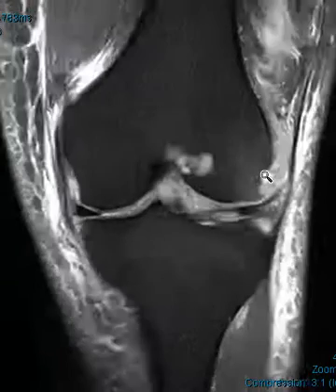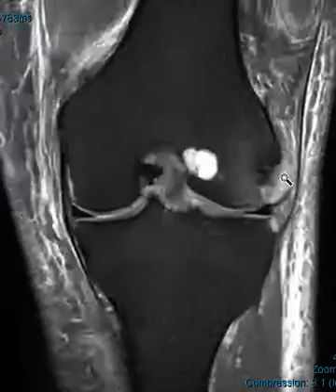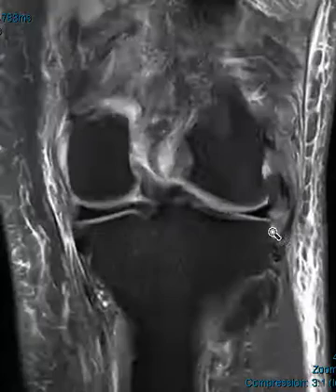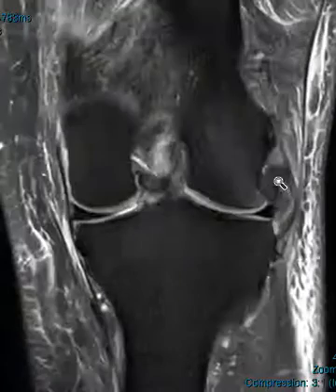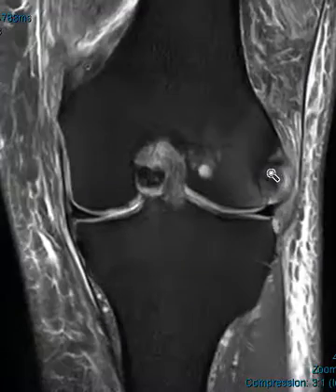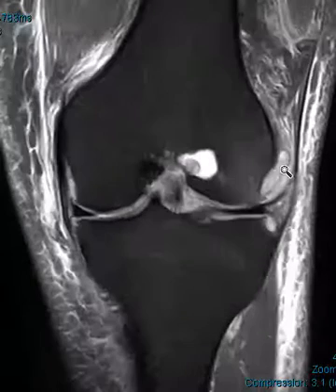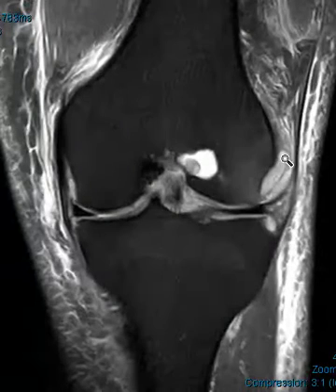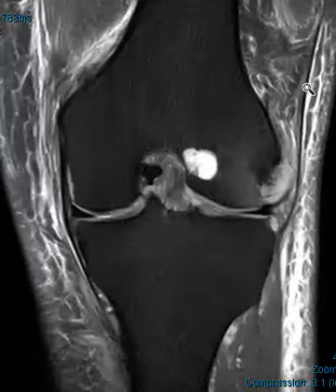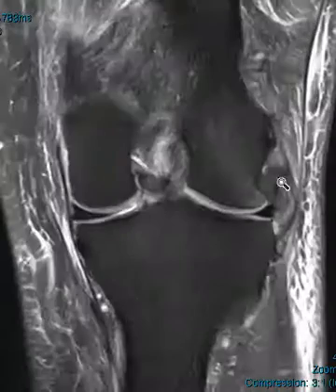So the main finding here that gives us away, it looks like, is this chronic erosion, and it's right around this popliteus tendon. So the popliteus tendon wraps around here laterally. We can see this gray thing right here is the popliteus, it's really thick, and again in front of that and associated with that there's this area of brightness, which is synovial thickening or synovial inflammation. This is the iliotibial band displaced outwards over here.